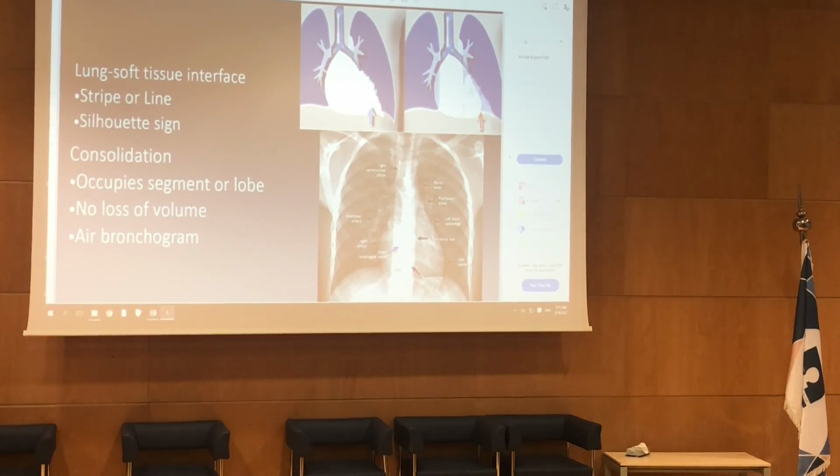It's not at the interface of the heart, okay? It's not the part of the lung that is closer to the heart. So what part of the left lung is not in contact with the left margin or apex of the heart? It's the left lower lobe, right? The left lower lobe. It's not in contact, so that's why I see it.